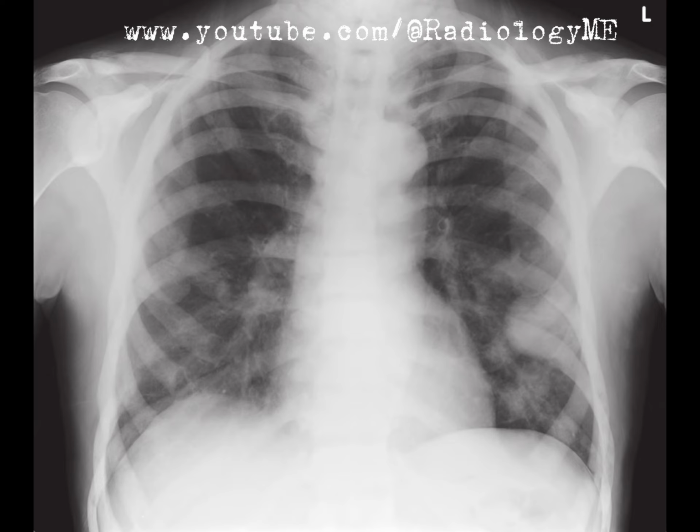Now, if this were a female patient, we'd need to think about metastatic breast cancer. Breast cancer can also cause sclerotic metastases, though lytic metastases are more common. The absence of visible breast shadows on this radiograph could indicate a history of mastectomy, which would strengthen the case for metastatic breast cancer. Looking for other potential causes of diffuse bony sclerosis, we also need to keep in mind other neoplastic causes like hematological malignancies, such as lymphoma, or even rare conditions like osteopetrosis. However, the combination of large pulmonary nodules and diffuse sclerosis makes metastatic disease much more likely in this case.